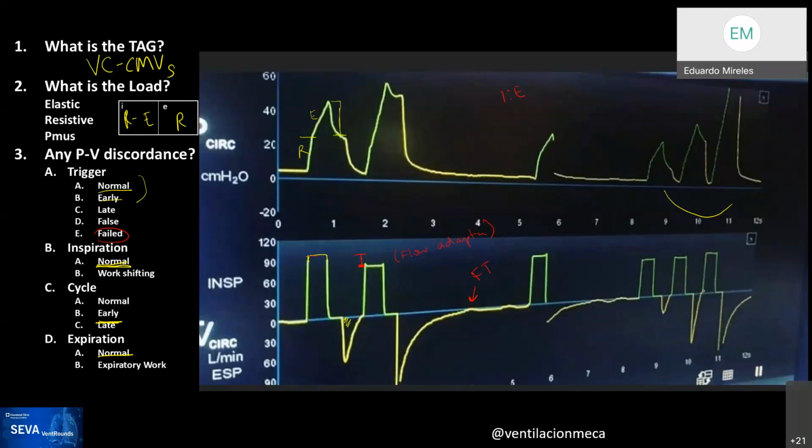So I don't know what triggered these three breaths. I wish Federico was online so that he could help us to hear more about this patient. But yeah, really challenging waveform. All right.